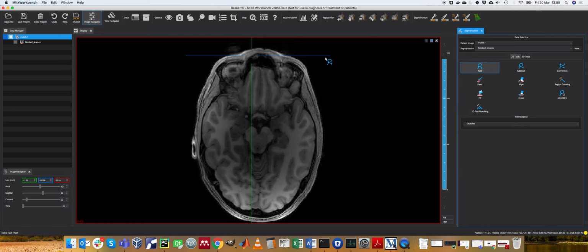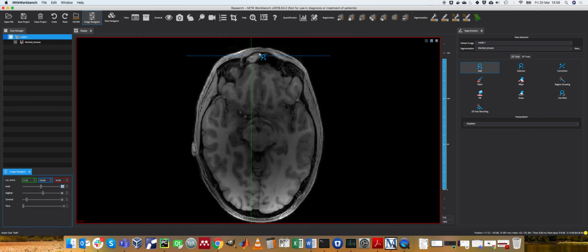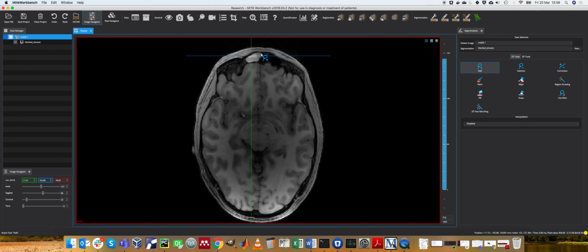I'm selecting a tool. Here it's a contouring tool, so I just draw around the thing I'm interested in, and then I move on to the next slice. This is quite a typical thing. In clinical practice, most workstations, I guess, or most outlining, it's still called contouring because that's what people are doing. At least it's slow, but it can be done very accurately and reliably.